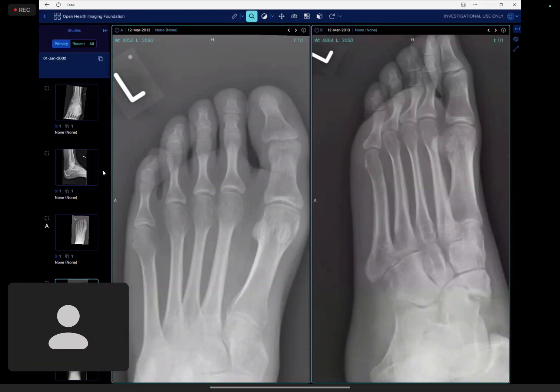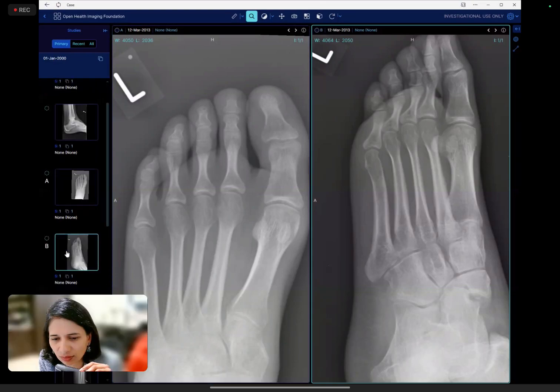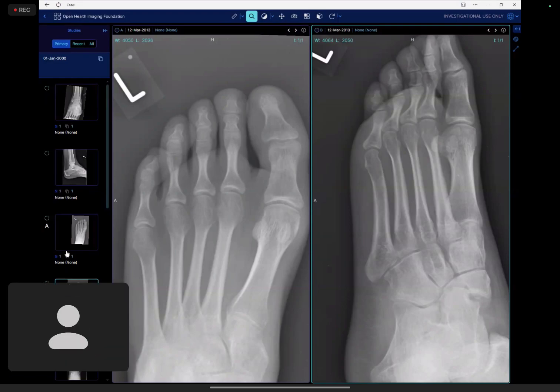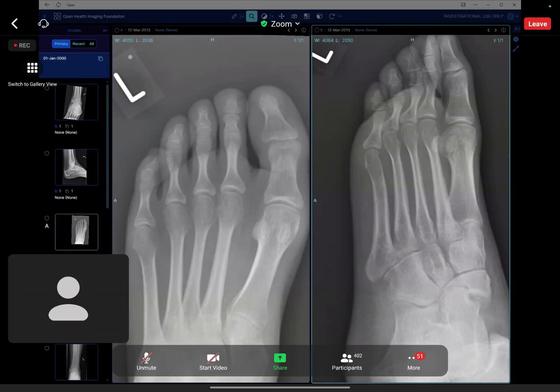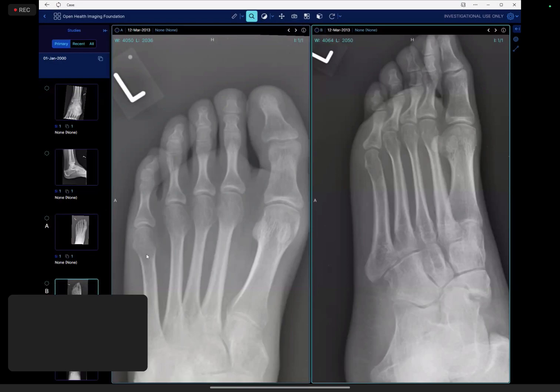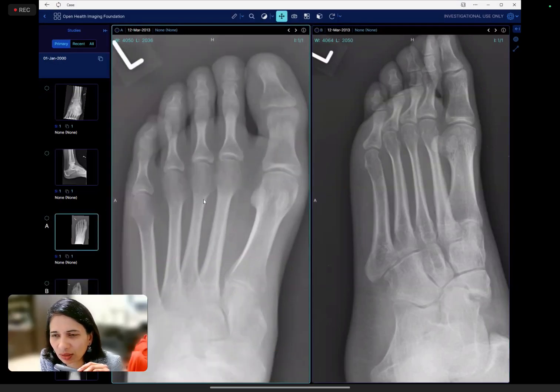Yeah, it seems like they are also on the oblique view. The marrow on the fourth and fifth metatarsal is slightly enlarged. Okay, so your money is in the midfoot.